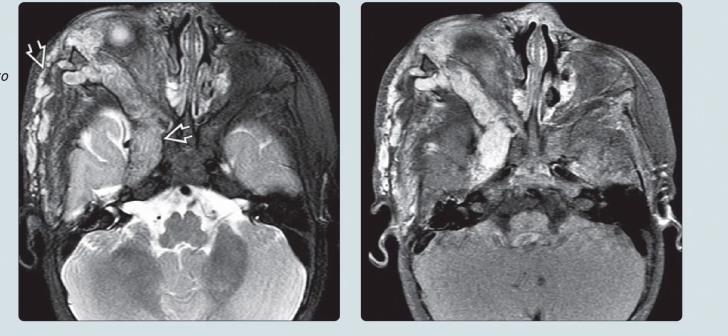Left is the axial T2 fat suppressed MRI in an 18-month-old child, and it shows an extensive plexiform neurofibroma, which is infiltrating the scalp, orbit and extending into the cavernous sinus through the superior orbital fissure. Note the bag of worms appearance.